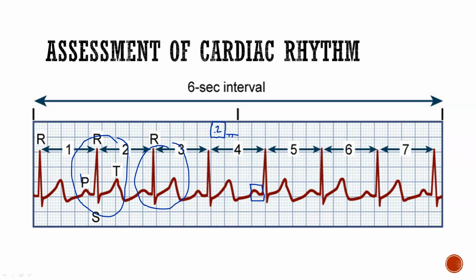I need to make sure that the QRSs are skinny. Again, I don't care about up or down. If the QRS went down this way, I don't care. It doesn't matter. It's just how you're looking at the heart. And then I need to make sure that the ventricles are relaxing. But again, the T wave does not affect my interpretation at all.